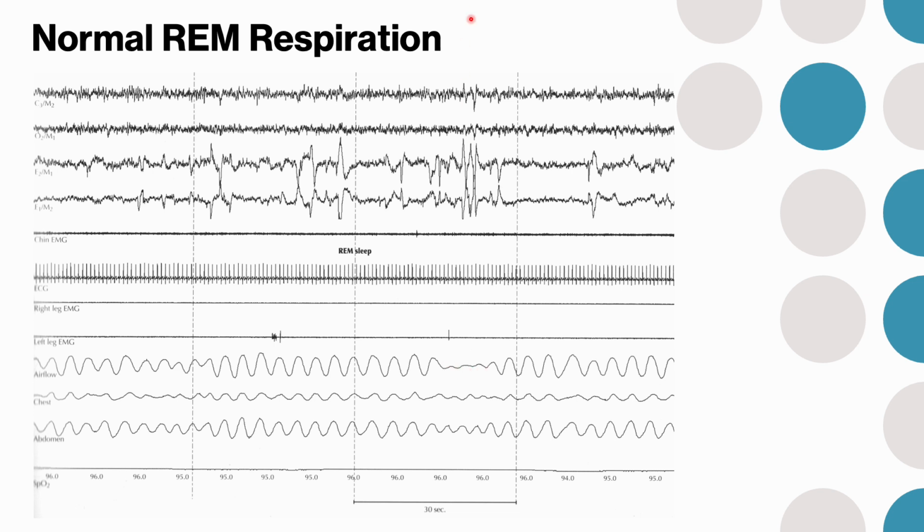The patient looks like they're having a central hypopnea because the effort has decreased. Here we have nice in and out breaths. It's a little low, but that's probably just the size that the technologist has. And then you can see it really decreases here. Really big waves here, smaller here. This happens as the eyes are clicking.